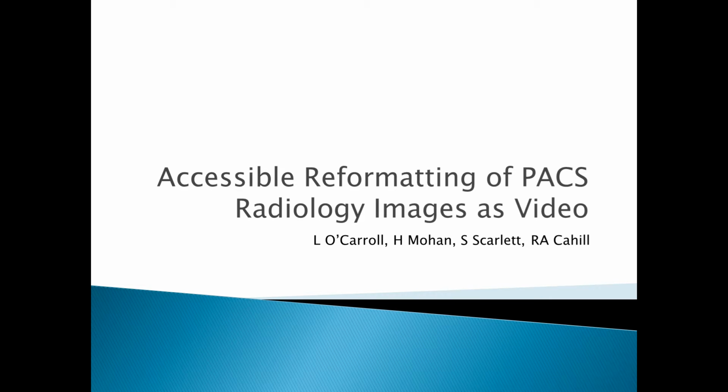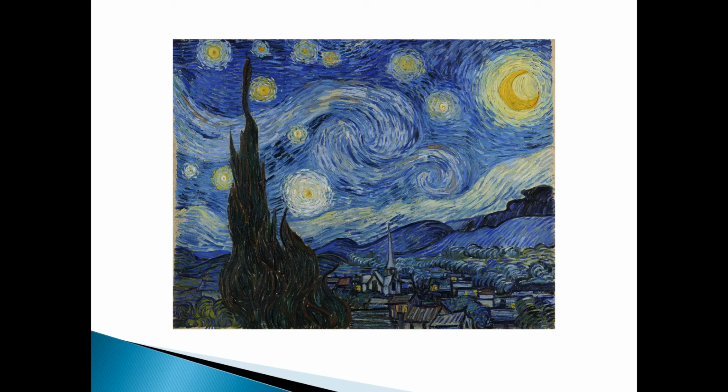Hi, my name is Lorcan, and today I'm going to show you how to reformat PACS images as video, and hopefully we'll also cover why this might be an interesting thing to do. It's often said that a picture is worth 1,000 words, and this is certainly true, particularly in fields such as surgery, which rely heavily on visual understanding and spatial relationships.